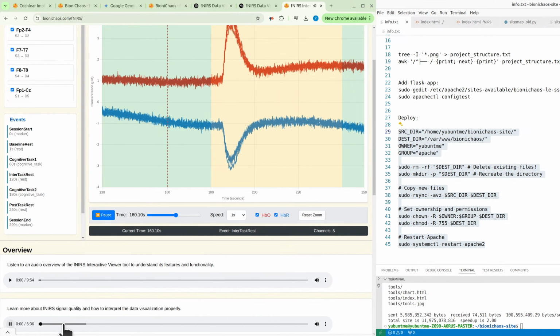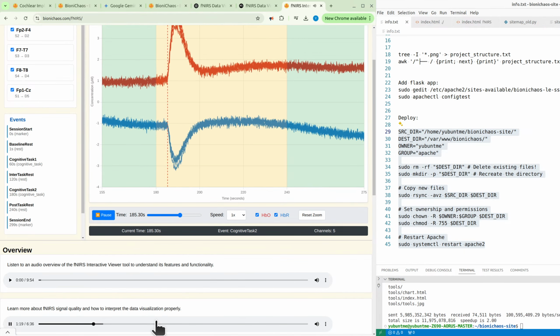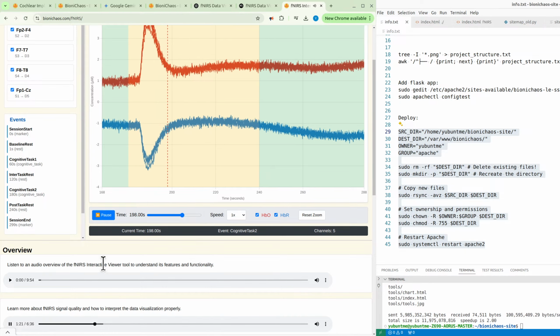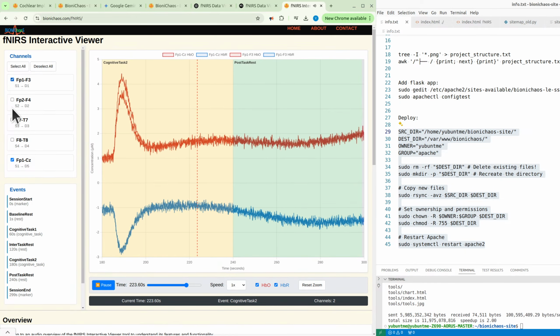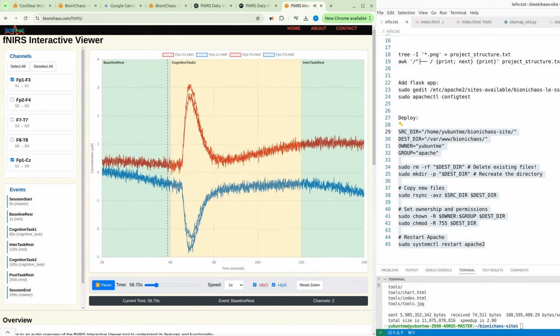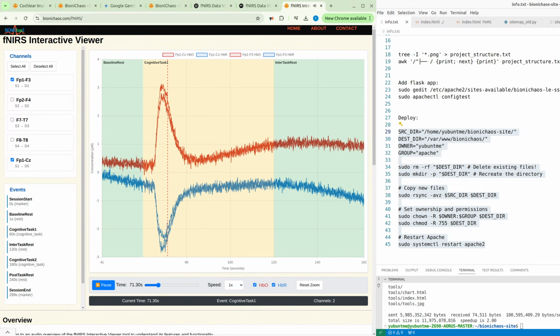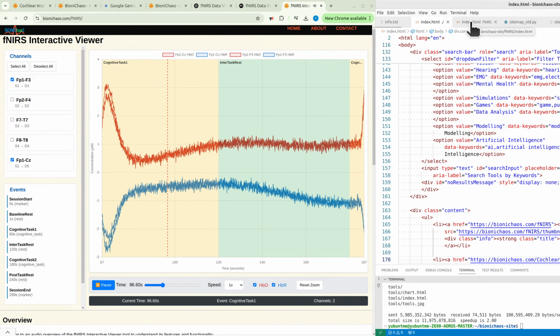Okay, welcome to a deep dive. We understand what this viewer shows. The basics, the line, temporal lobes, key cognitive areas. And the viewer breaks it down visually, right? With those colored backgrounds showing cognitive task 1, intertask rest, things like that. Precisely. It helps you see the structure of the experiment. Plus, it has interactive bits, playback, selecting channels, zooming in, hovering over points to get specific values.